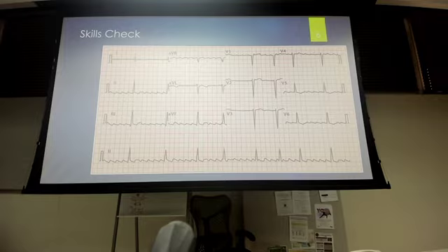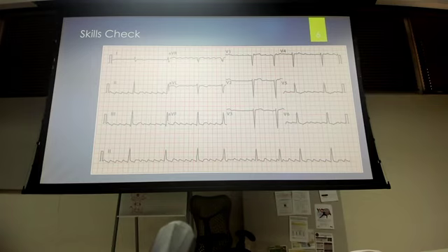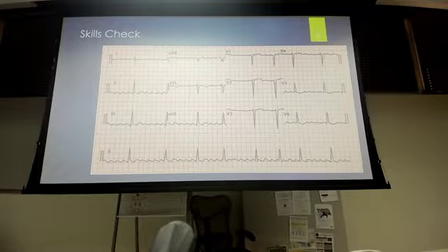Looks like an atrial flutter. Atrial flutter, right? Because we look at those flutter waves. Okay? And the difference between AFib and A-flutter, besides we talk about regular and irregular, is AFib, multiple foci in the atria that are going haywire. A-flutter, one foci, and that's why we have those flutter waves that look very similar, because it's coming from one foci in the atria.